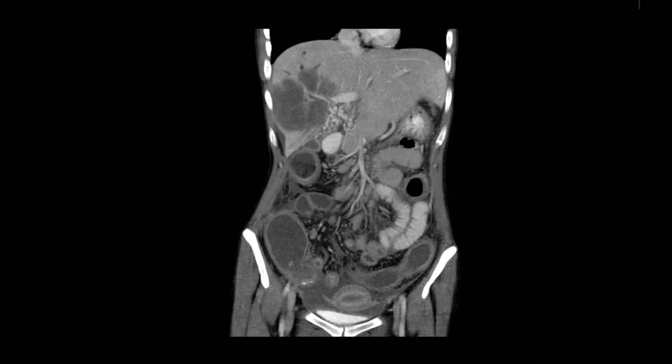Could be metastatic from adenocarcinoma of the colon, a complication of inflammatory bowel disease. They have a high chance of developing cancer in the colon, which can metastasize. Okay. Fourth one is lymphoma.